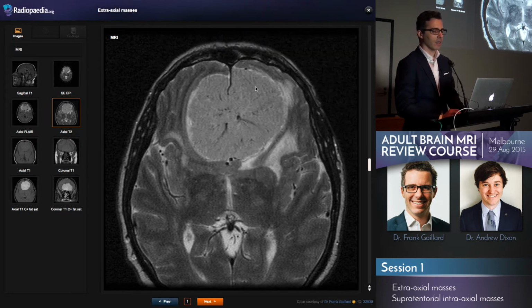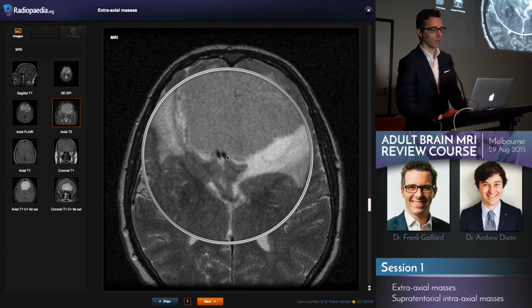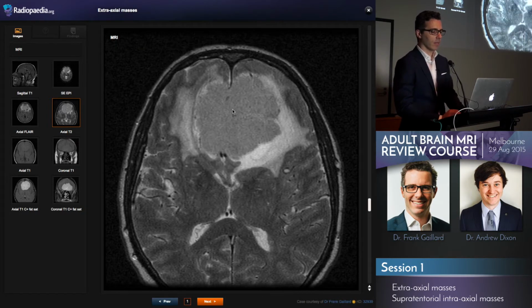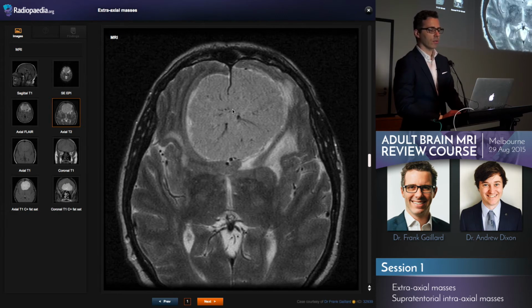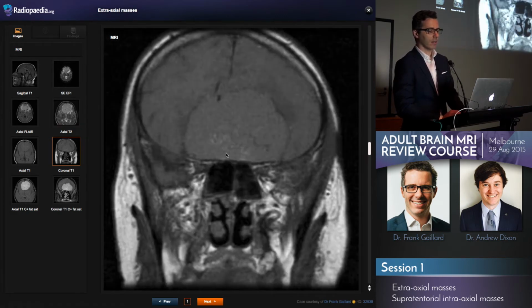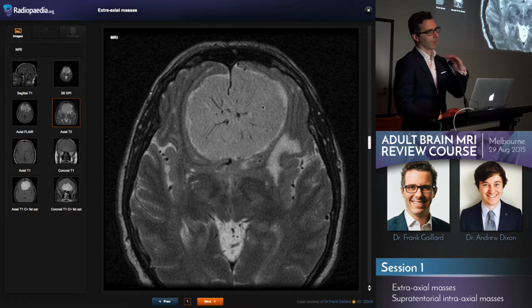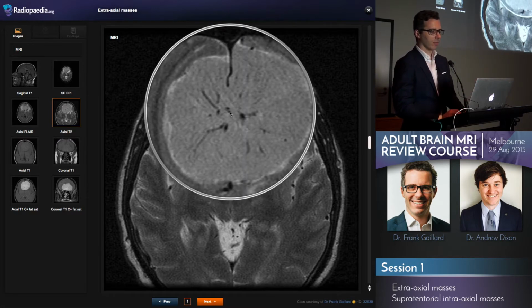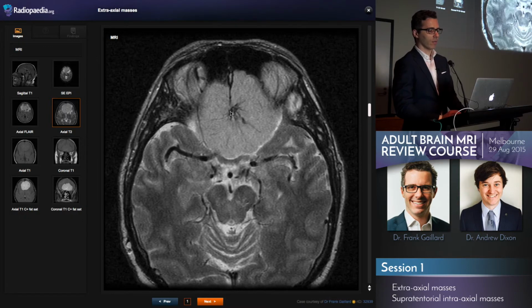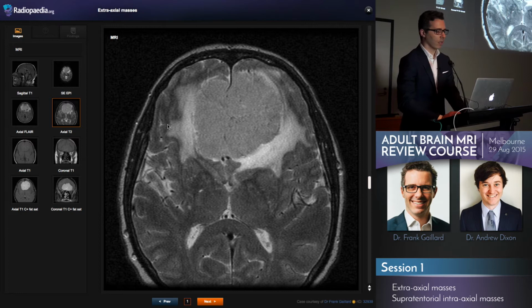So intervening pial vessels is a very useful sign. And note the anterior cerebral arteries are displaced posteriorly here. The other thing meningiomas do is that they start in one little spot, down here in this case on the planum sphenoidale, and as they grow, they bring with them their arterial supply. So when you cut through it axially, you can see this spoke wheel appearance, as the supply radiates out from where it originated, along with the meningioma.